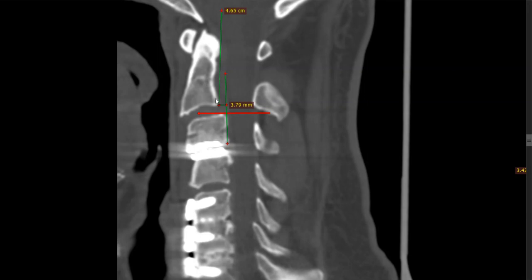The larger aspect is what happens on digital motion x-ray, what happens when this patient looks down versus looks up. Looking up will obviously slide back probably to the correct position, but looking down, would it get worse? Big question. Surprising how good the space is between C2 and 3. That's actually really good. It's hard to judge. I'll have to skim through this to see whether this ADR slipped forward. This is pretty much done correctly here.